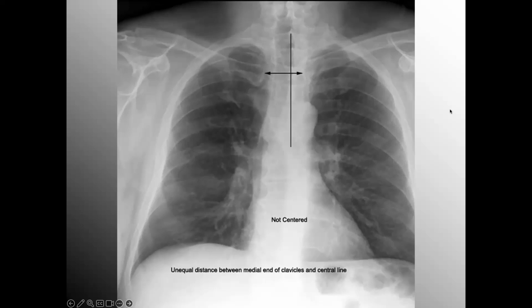And you say, of course, we're in the chest cavity, but it helps to find these landmarks on your patients. And of course, this is our center point. This is our reference point for perfect centering of the airway with the spinous processes. And notice the airway is slightly offset towards the patient's right. So we would say there is a very mild tracheal deviation towards the right in this case.